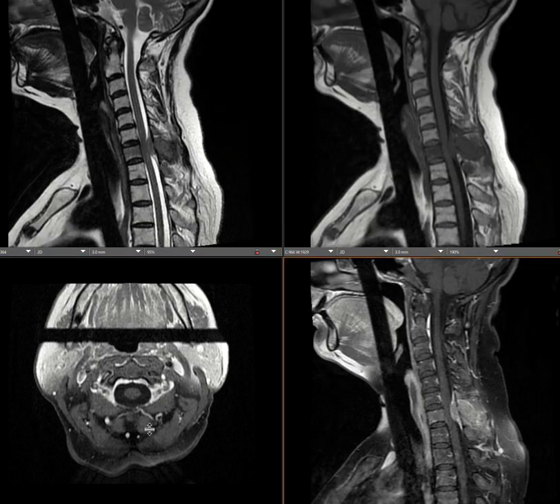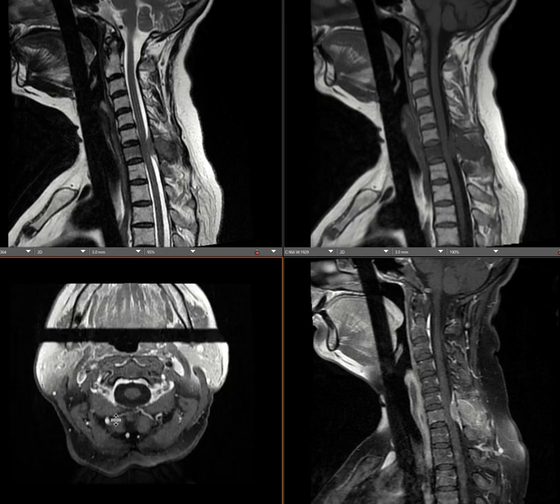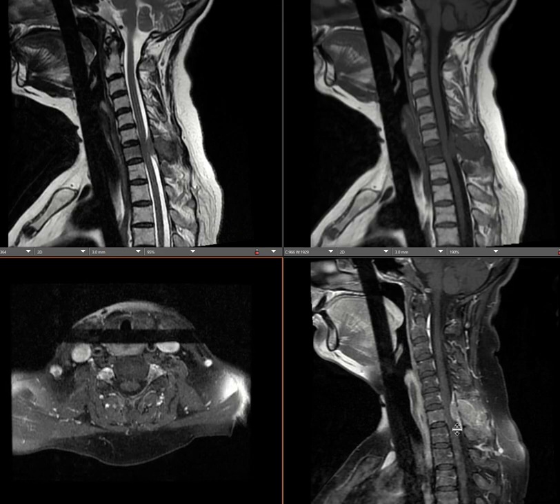This is an actual T1 fat SAT post contrast. We see all this fat is suppressed, and then we see the vasculature that shows this is a T1 fat SAT post contrast, and the image on the right bottom is going to be the sagittal T1 post contrast sequence.